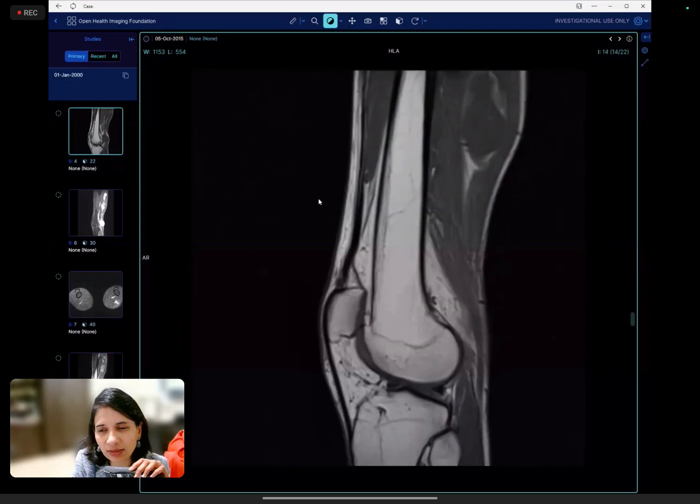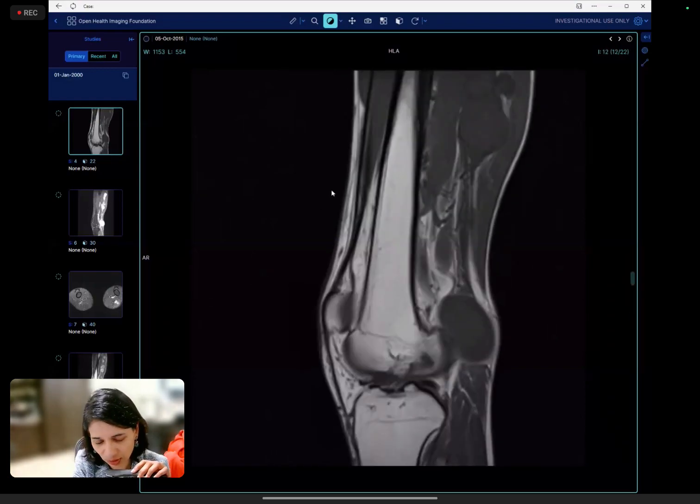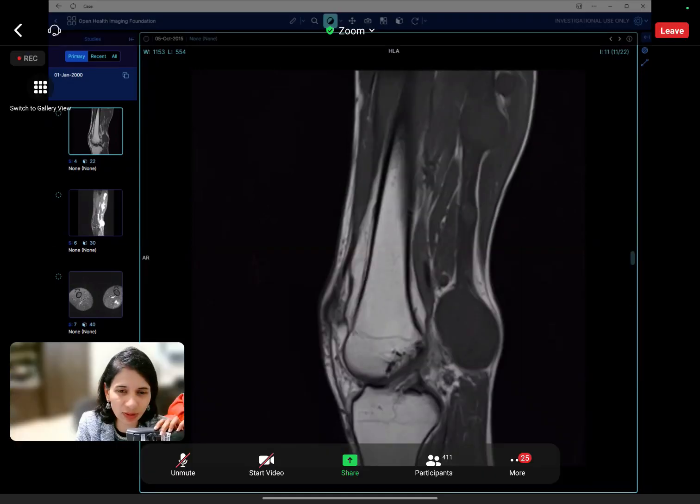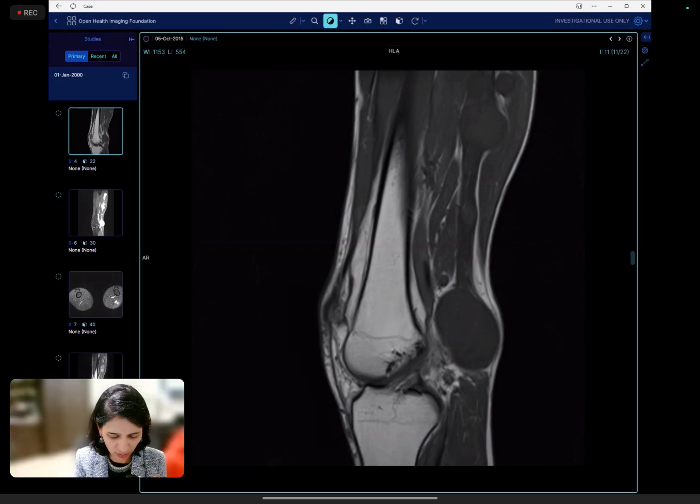So just know the other features, so that when they give you the case, it's quite obvious, there are big lumps there, and when you get to the diagnosis, you want to know a little bit more about these conditions. NF is quite a favorite for the exam, for 2A, for 2B, they can ask you a lot of questions. Okay, so well done on that. And the last one that you did was 22.